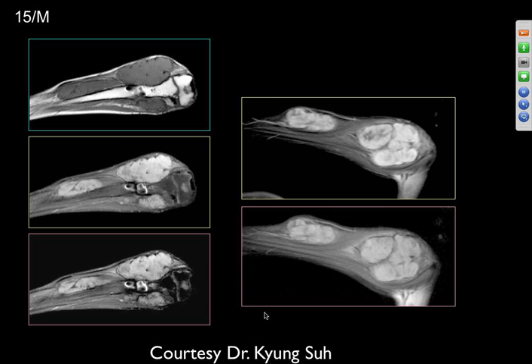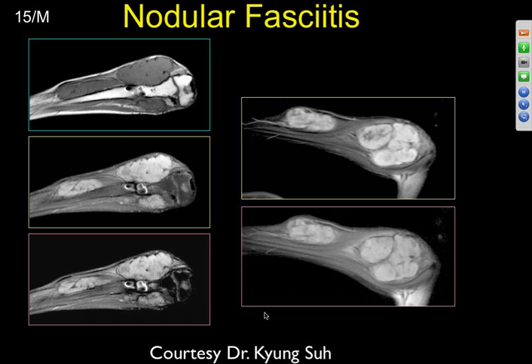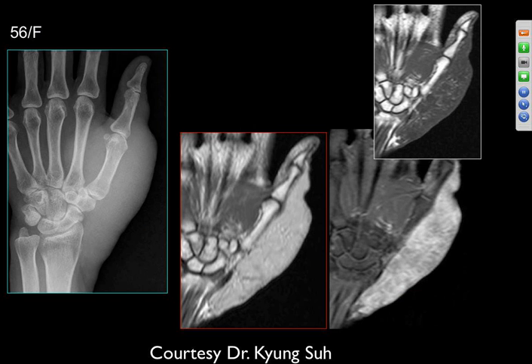In a 15-year-old soft tissue mass, I would be concerned for a sarcoma. I'm trying to see if there's anything characteristic about this lesion. Yeah, nodular fasciitis. I'd be concerned that this is a malignant lesion, even maybe a little bit of rhabdomyosarcoma or some of those, but this turned out to be a benign lesion. So, yeah, got to work with the pathologist.